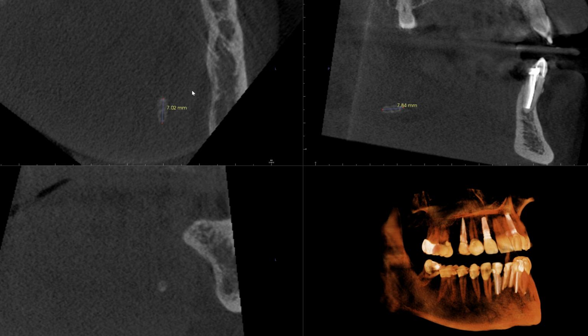And if we pay close attention, overall, how would you describe this appearance? You can use the word linear opacification or opacity, or you could say that it appears somewhat tubular or channel-like. And I like the term because the word that we use to describe its shape is very indicative of what this opacity would be, right?